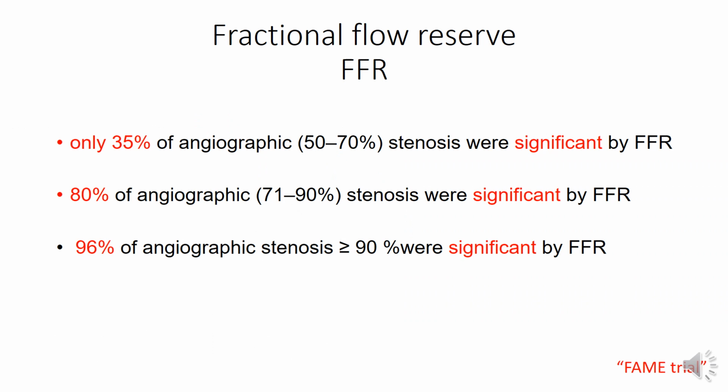So I don't have FFR in my cath lab. How accurate is my angiographic evaluation of the lesion? Data from the FAME trial give us insight about this question.